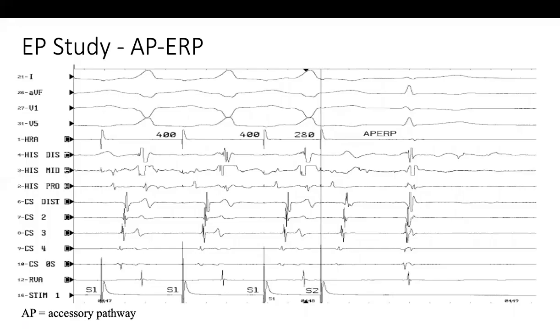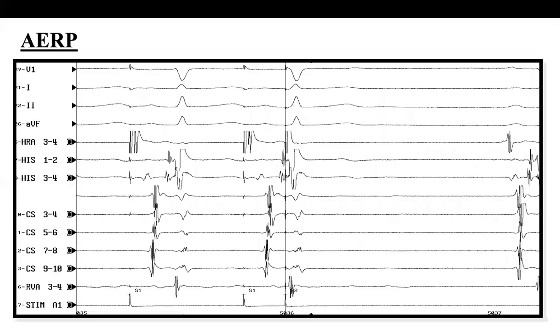I don't know without pacing, and I need to see. Yes, let us see this ventricular electrogram. This is A and V. Yes, A and V. You see that the V is small, smaller than what we are seeing in the A.